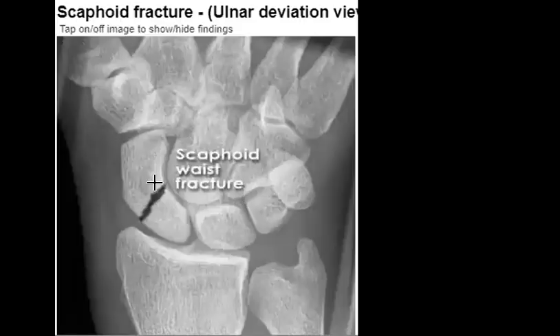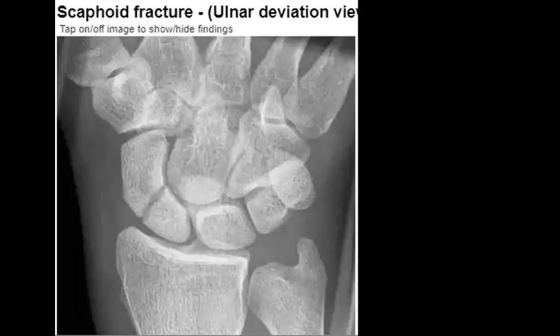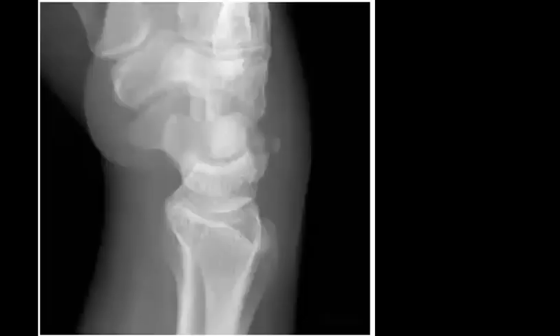So the most common one, as you know already, which we saw many times, is the scaphoid fracture. And it has many associations. So when you find the scaphoid fracture, you should search for any associated fractures. Don't forget, the zigzag line here is very obvious as a normal that you should be used to checking. So now it will be easy for you to recognize the abnormality here. So which abnormality do you see now?